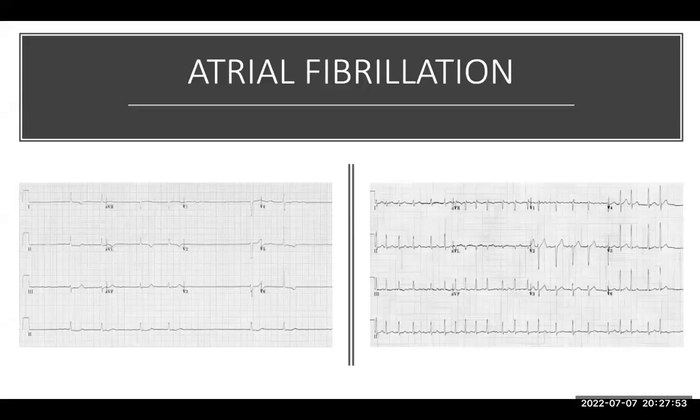Finally, second last part, we are going to arrhythmias, and I'll not go into all the arrhythmias. The important thing is what I want to go through very fast. Atrial fibrillation is straightforward. Nobody will ever miss it. There are only two, three things you need to remember in atrial fibrillation. Always look at the rhythm lead, lead 2. Ask yourself, are you seeing a visible P wave? No. Is the rhythm regular? No. That is atrial fibrillation until proven otherwise, period.